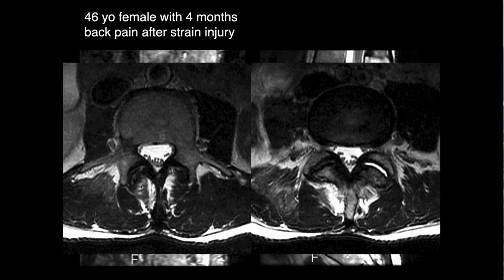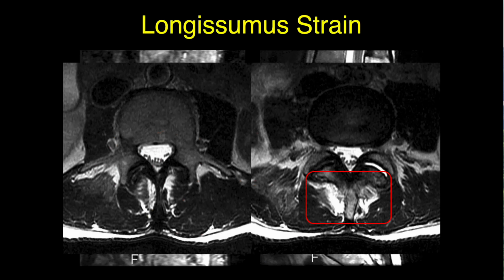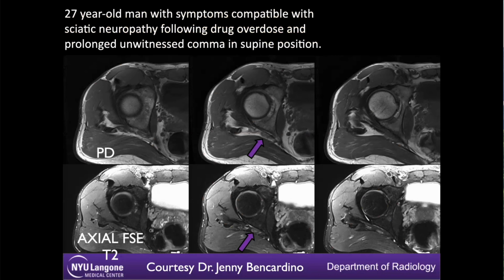Right. And here we can see on either side the edema within the erector spinae muscles there. And that's all longissimus strain. So you have to remember muscle strains. All right.